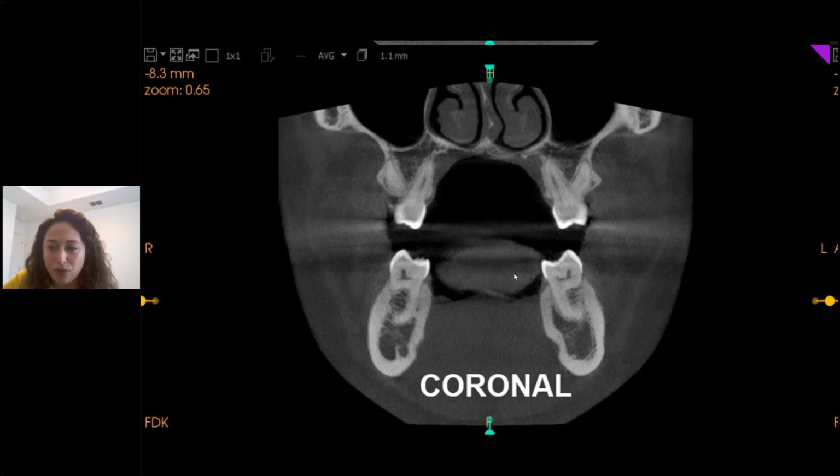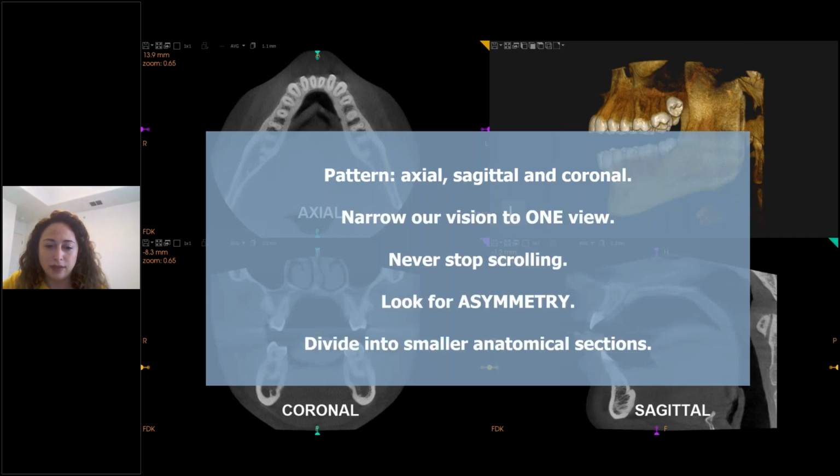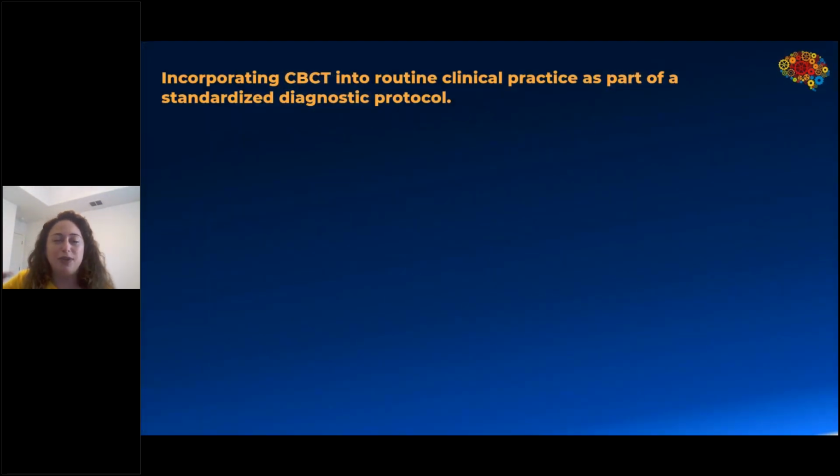And this is kind of what we focus on in our hands-on sessions. I hope that by the end of the day, after looking at this many scans, it will be easier to apply in your practice, in your office. Looking from outside to inside doesn't mean that that's the way you're always going to do it for the next 100 scans. But in the beginning, when we're trying to create our own system, it is important to spend energy and time on each one of these structures.